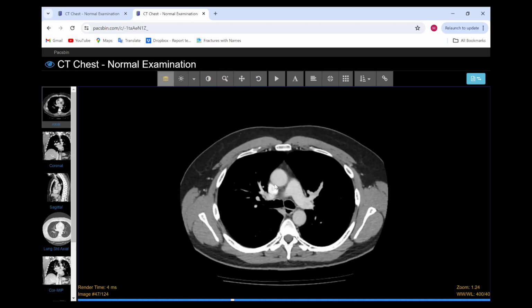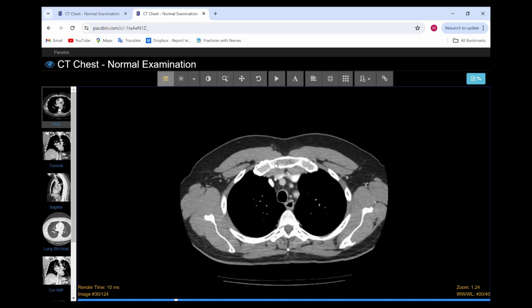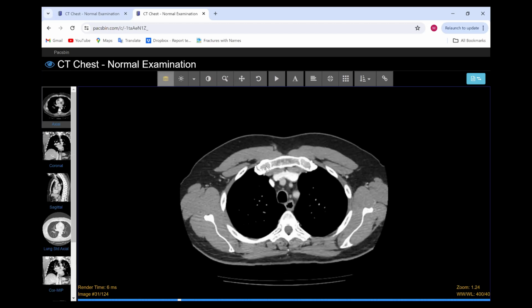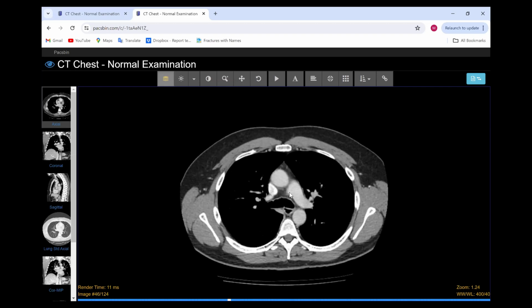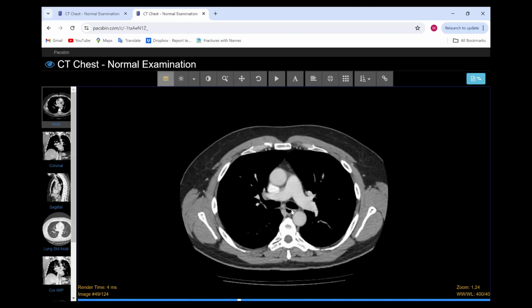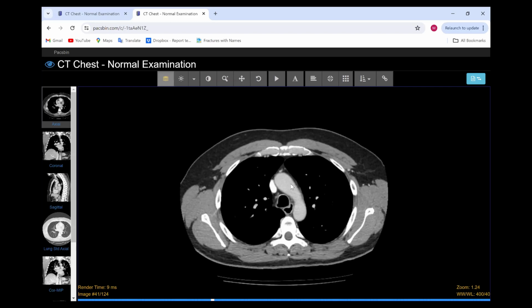So regarding the lymph nodes, there are a lot of stations of lymph nodes in the mediastinum. It is not important for you at this time. We have para-aortic, we have retrotracheal, subcarinal, a lot of stations, but you should look carefully for enlarged lymph nodes. Sometimes it is due to TB, sometimes enlarged lymph nodes due to sarcoidosis, malignancy, and so on. What I want to tell you about lymph nodes, and it's important at your level, is to know the diameter of a lymph node. It should not exceed 1 centimeter in the anterior posterior view.